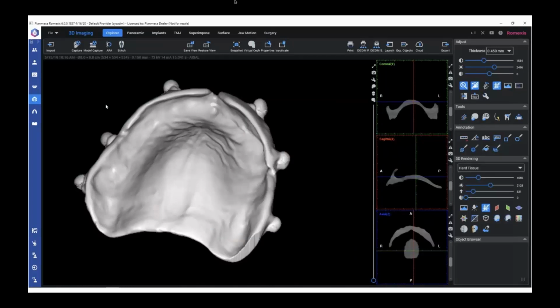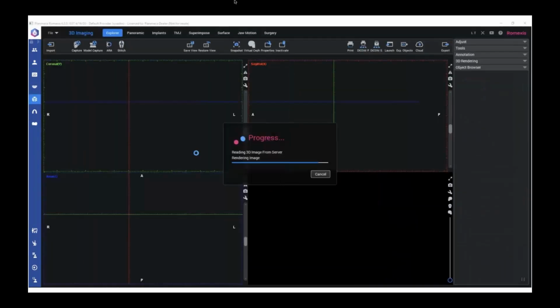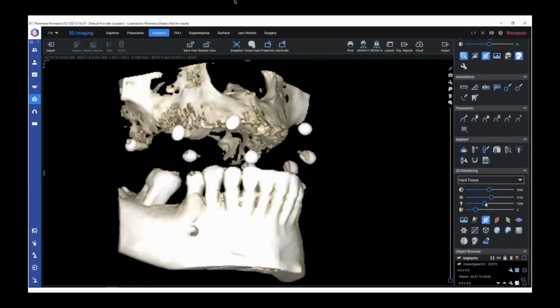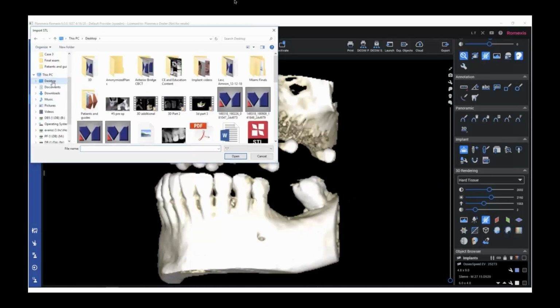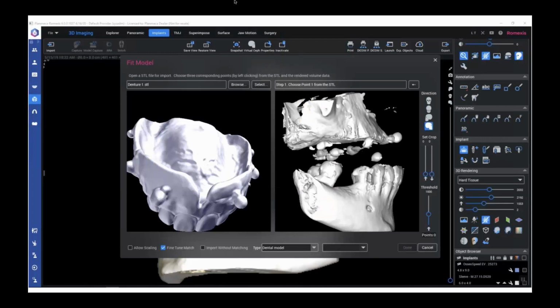But what we're going to use it for is we're going to import this into the patient's CT scan, right, using these common radiographic marker points. And by the way, you can buy radiographic markers from vendors, and those can work pretty good. I found that some of the glass beads that we're getting throw off a little bit of scatter. Here's what we use. We use expired composite. So if you have any laying around your office, just go ahead and make some 3mm little roll-ups and cure them and sticky wax those onto the denture, and they work fantastic, we've found.